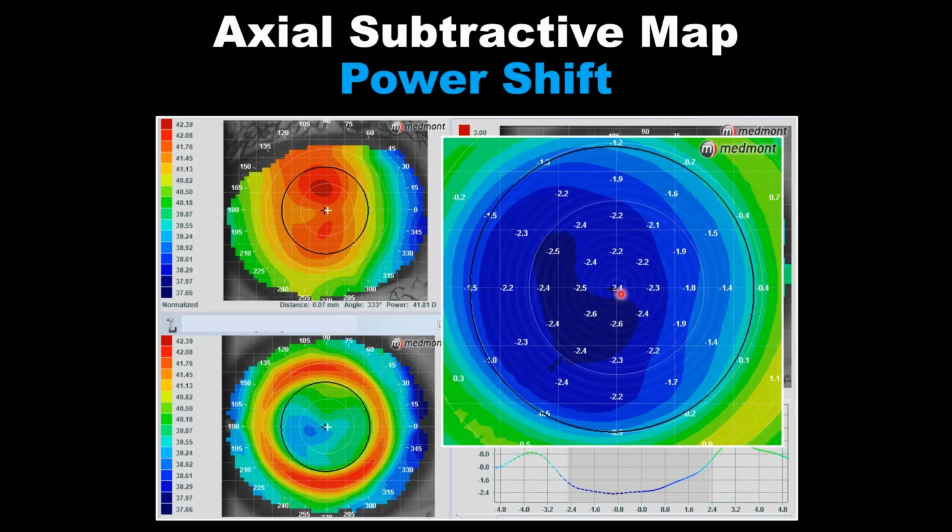So that's a 2 diopter shift in power, or a 2 diopter add. If we compare the apex to heading superior, we go down to 1.2 diopters minus, so a 1.25 diopter shift. If we head temporally, we drop about a diopter, so effectively a 1 add heading toward the temporal side. And then heading inferior, we drop down from 2.4 to -0.5, about a 2 diopter add.